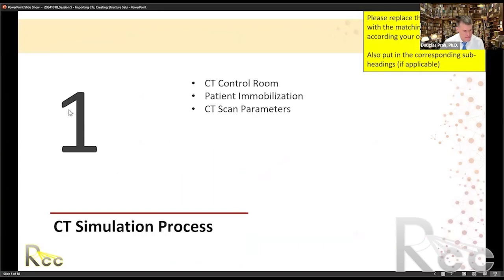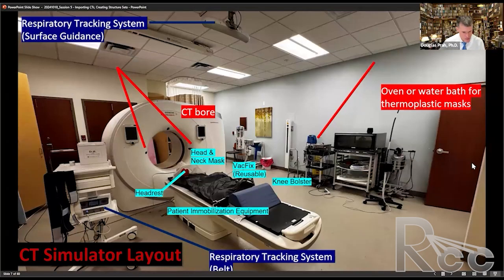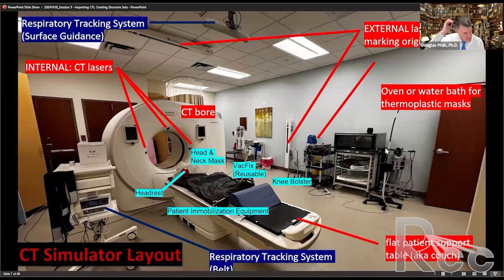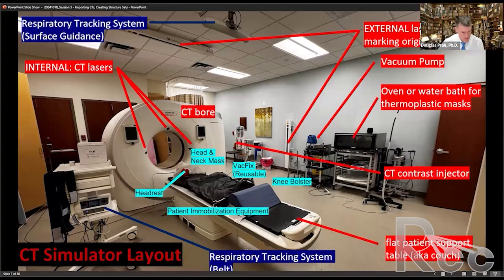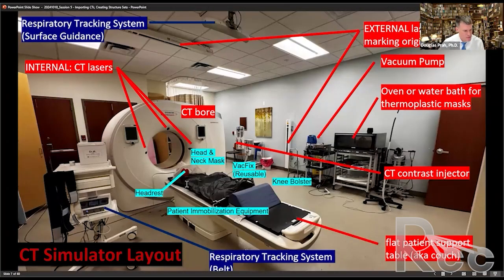So step one here is the CT simulation process. As I mentioned, we're at this first square. What we have here is a picture of a CT scanner at one of our sites. I just wanted to review the layout and some of the equipment that we have in the room. I didn't realize some of these things were movies. So let's start out with just in general, this is a CT scanner. It's a pretty standard Siemens CT scanner.